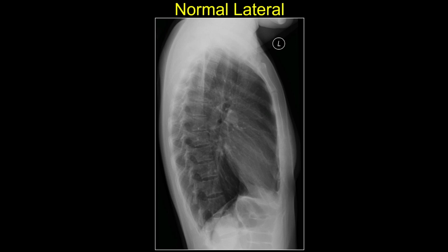One of the things that I found peculiar with students and residents is that they ignore the normal anatomy and they ignore looking for abnormalities on lateral chest x-rays, and I think that's mainly because they do not understand it clearly, although it is more simple than you think. To make the concept of understanding the lateral hilar anatomy easier, we'll link that to a metaphor. Let's start by understanding this.